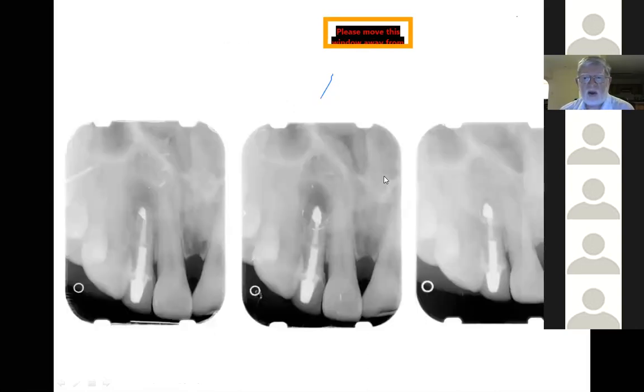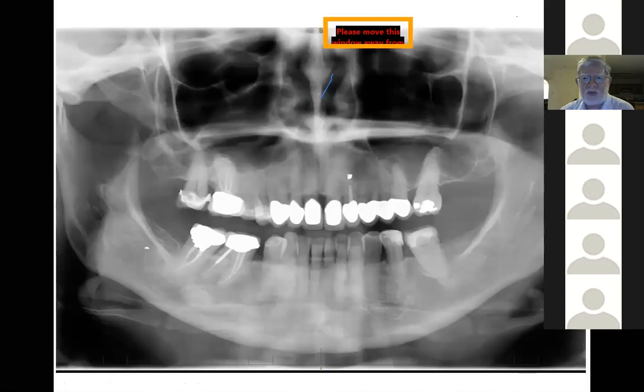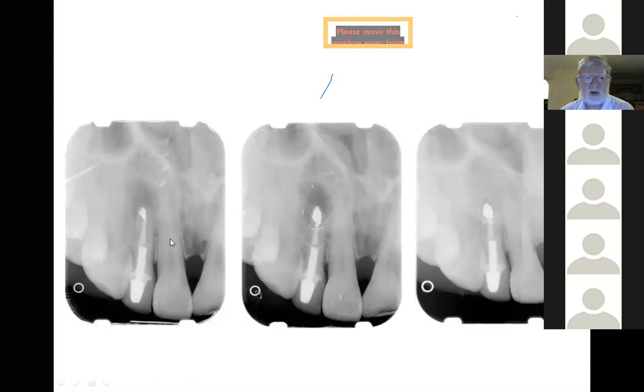So we had that case going back there where we talked about the apicectomy. This is an English dental assistant who worked for me maybe 2005 or so, so we're going back 15 years. She's got a porcelain jacket crown on there. This is pre-Emax days. There's a cast post and core. The endo was done. She'd already had an apicectomy done. She said she'd had it done twice, but there was a large periapical lesion.